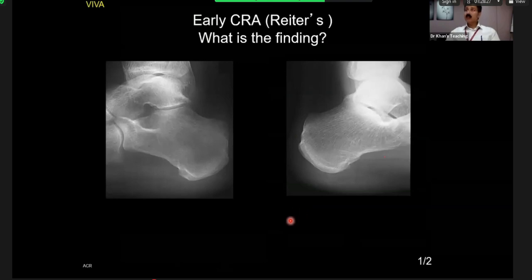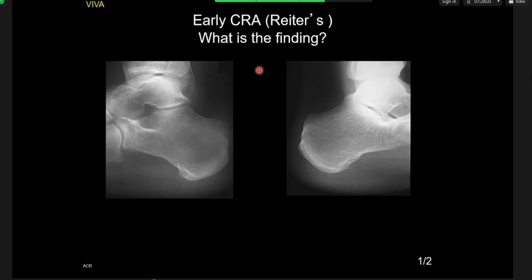Okay. Candidate number 5, can you raise your hand, please? Candidate 5, can you hear me, please? Yes. Okay, I have given you this is one side, this is the other side. It's a very important exam film, very subtle findings. So can you take over? What are the findings and which side is abnormal?